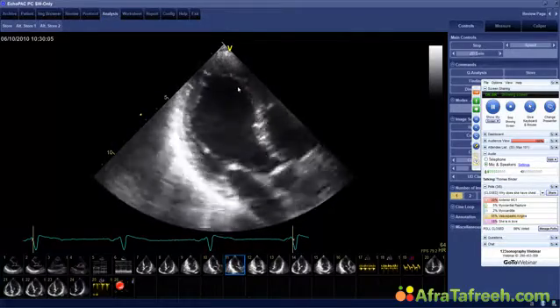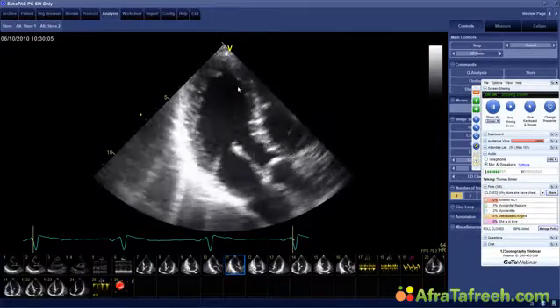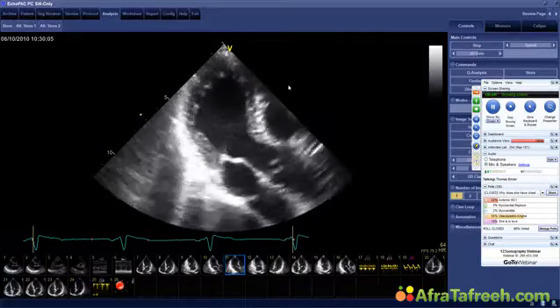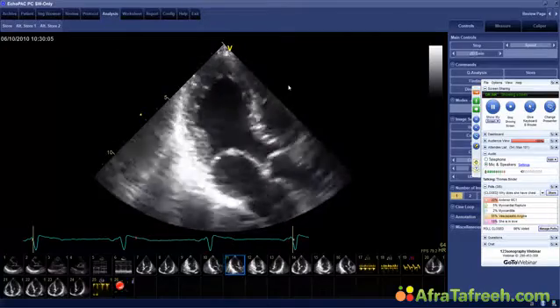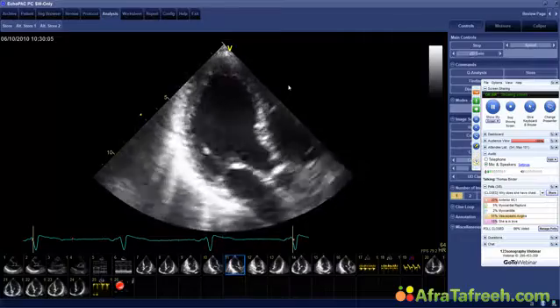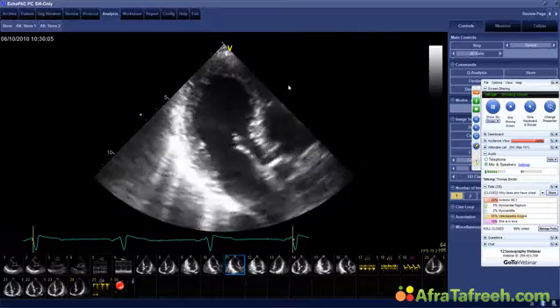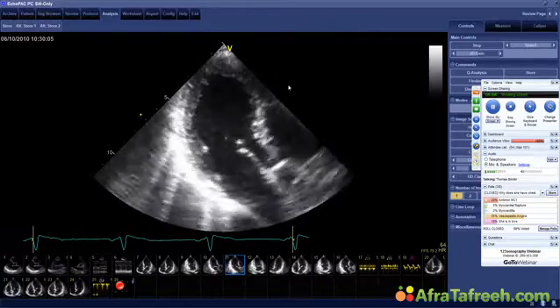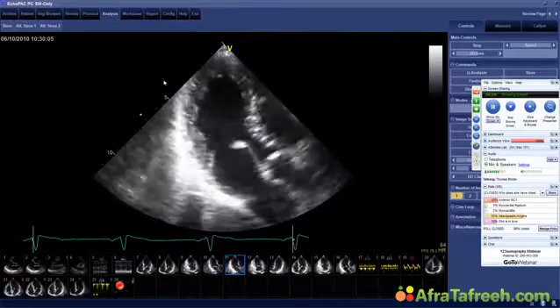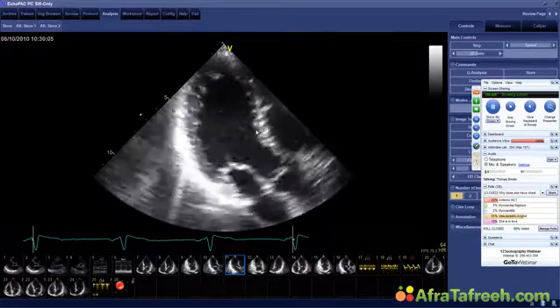And some of you already know the correct diagnosis, and I've noticed that Irfan and Alan said that this is something else, and they're correct. Basically this is Takotsubo syndrome. What is Takotsubo syndrome? It's the so-called broken heart syndrome. It's a form of cardiomyopathy that we are now aware of, where patients have very high stress levels and very high levels of catecholamines, and these high levels somehow lead to myocardial dysfunction, which typically is of the form where we see apical ballooning. In other words, where the apex is affected, which not always closely follows the territory of the coronary arteries, especially the LAD.